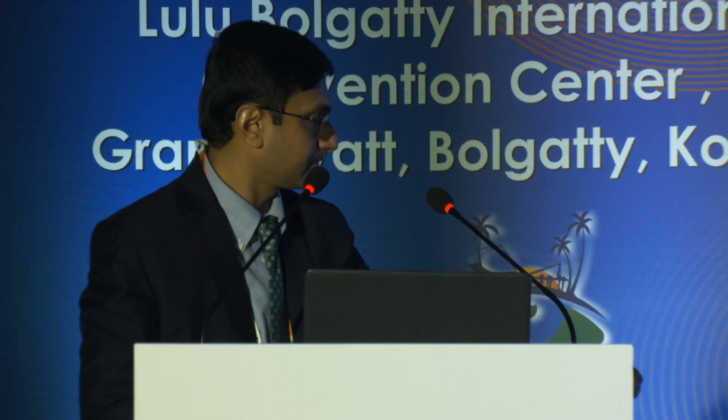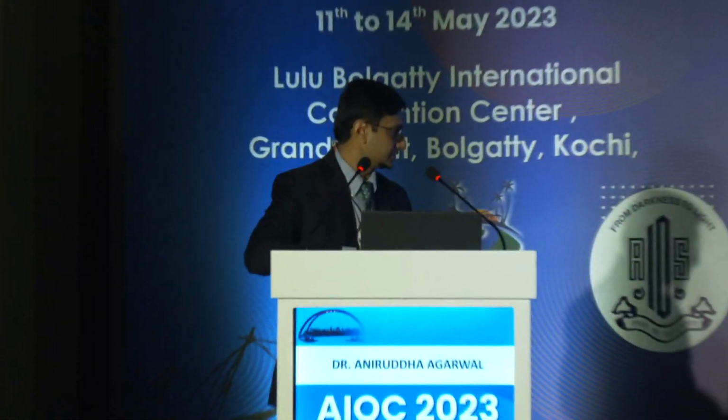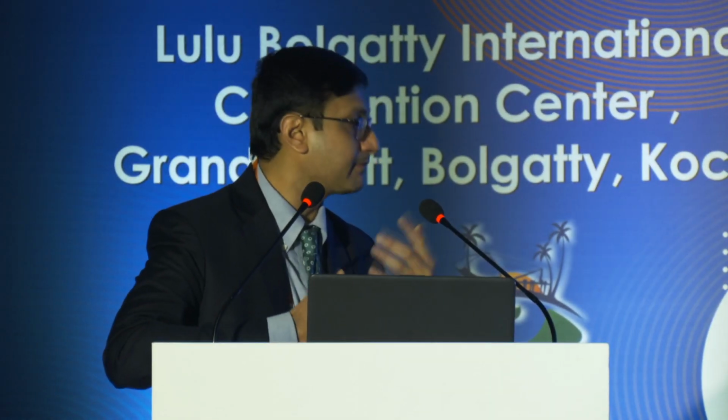Thank you, sir. The early drusen that you showed, would you call that a non-neovascular exudative AMD, or is it a separate entity? For this patient, I had a discussion with Giuseppe Querques, and we looked at the OCT angiography quite thoroughly. We did not find any evidence of neovascularization. So he said that we believe this is a micro neovascularization, probably not apparent on OCTA, or this is a leakage from the drusen itself. The drusen is supposed to leak or exude. I don't know how it does that, but this is all hypothesis, I think.